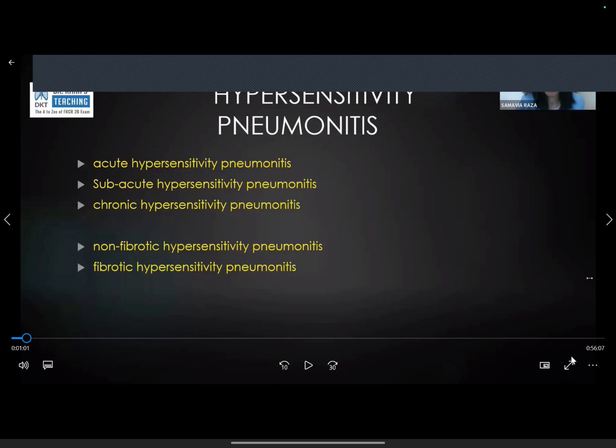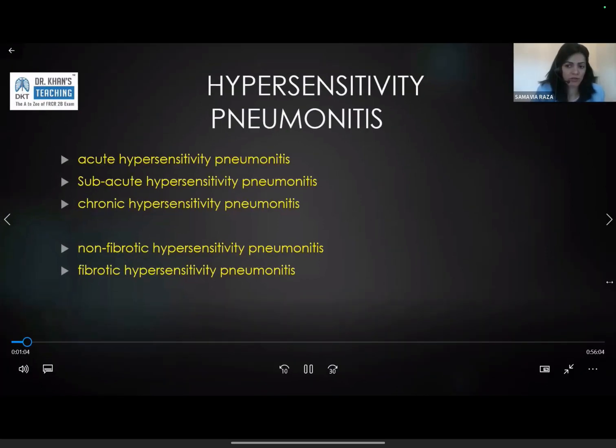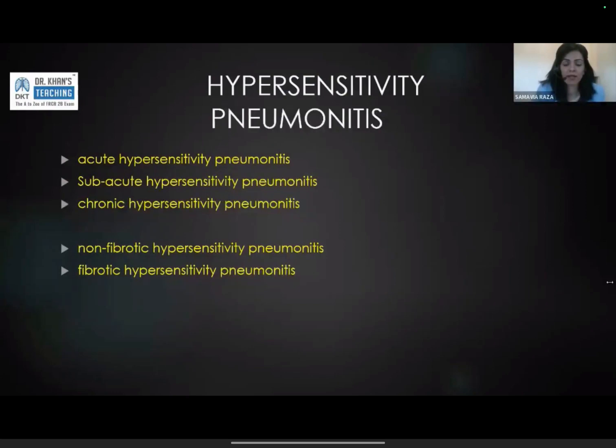Central lobular nodules are essentially just dots, very subtle. It can be ground glass, very fluffy looking, or they can be very discrete and more dense looking. But they are essentially just a dot with nothing around them, nothing touching them.